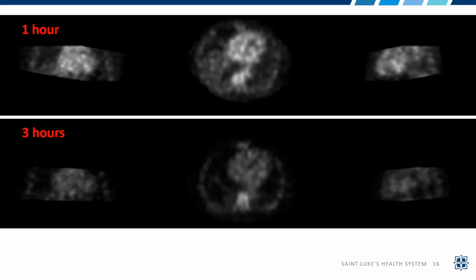Yeah, I think these negative studies are obviously the most challenging from a technologist standpoint, because when you don't see a definitive myocardial border, it takes a little bit more looking at with the processing. With some of the high sensitivity cameras, like CZT cameras, you've got to make sure that you truly have the heart in the center of the field of view. And in this example here, we don't have CT to really overlay it to make sure that we're registered well.